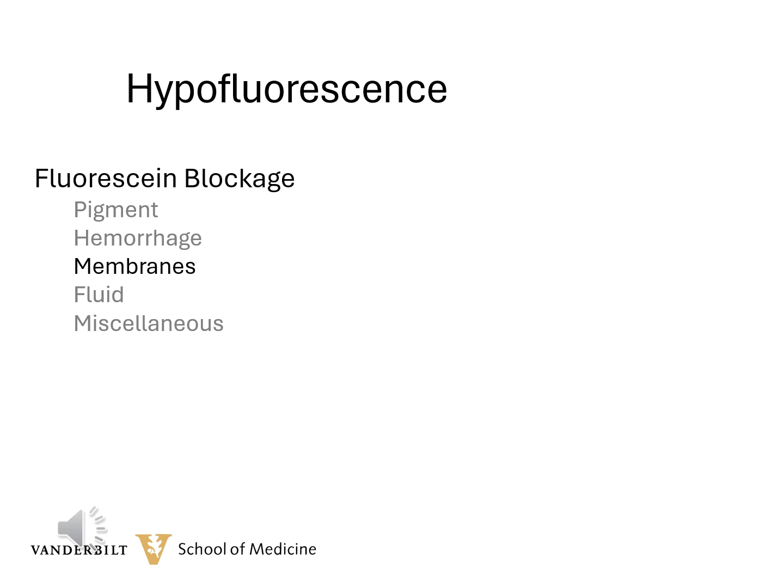Superficial membranes can be associated with any proliferative retinopathy, some congenital abnormalities, or some severe epiretinal membranes. These membranes are translucent and they can block fluorescence, although the blockage is not as dark and dense as the hypofluorescence caused by blood and melanin.